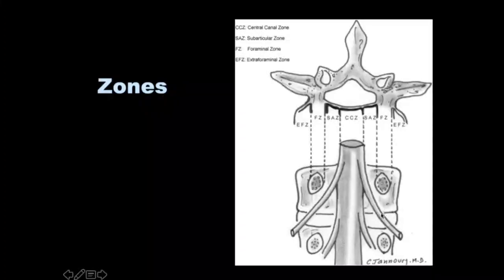This can be either getting pinched at the level of the foraminal zone, or at the level of the extraforaminal zone, or it might be getting pinched higher up over here, between the, so if this was the L5, this would be the L4 vertebra on top, and it might be getting a bit pinched at the L4, L5 level. So depending on where the nerve is getting pinched will have an implication of where they would perform the surgery. So that needs to go into the report.